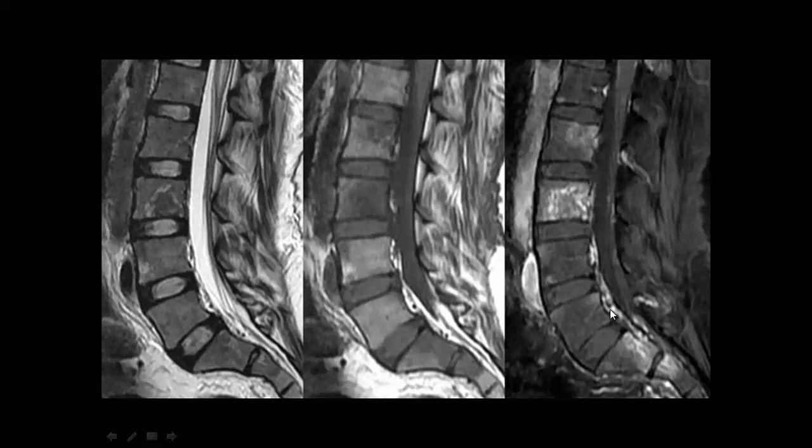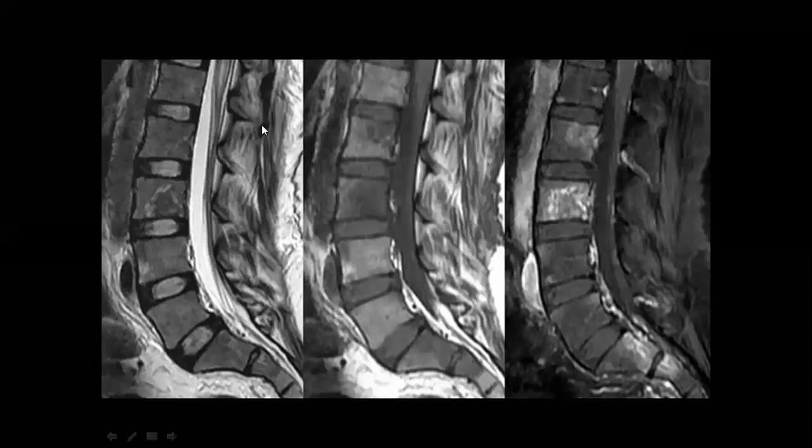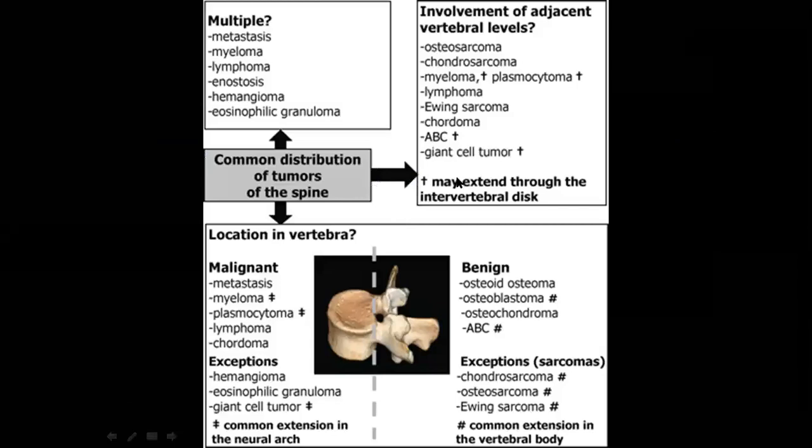So when it is high signal in the STIR, you go more with spine mets. Yeah, so when it is high in T2, maybe it can be hemangioma, but with low T1 signal and with the STIR high signal, and especially if this patient has a history of a known primary, don't rush for hemangioma, because hemangioma is, yeah. So this is very good.